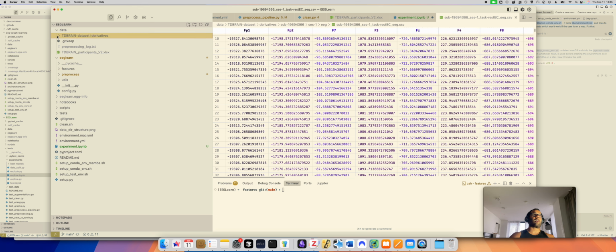Once you're there, you can get the clean data. I've removed everything here. You just run clean.sh, and this figures out your operating system, activates the environment if it doesn't already, and then processes the persistence files. Here, just to show you, I'm processing two random subjects because I've defined it to be sample two here, just for brevity.